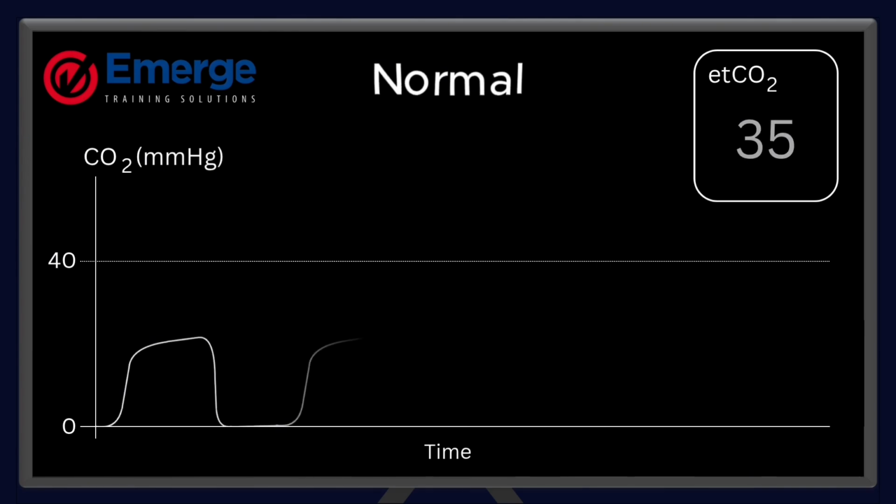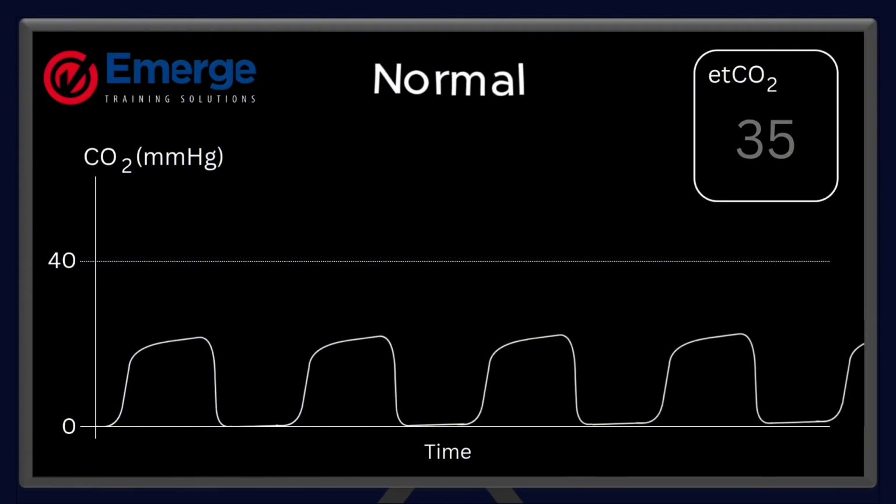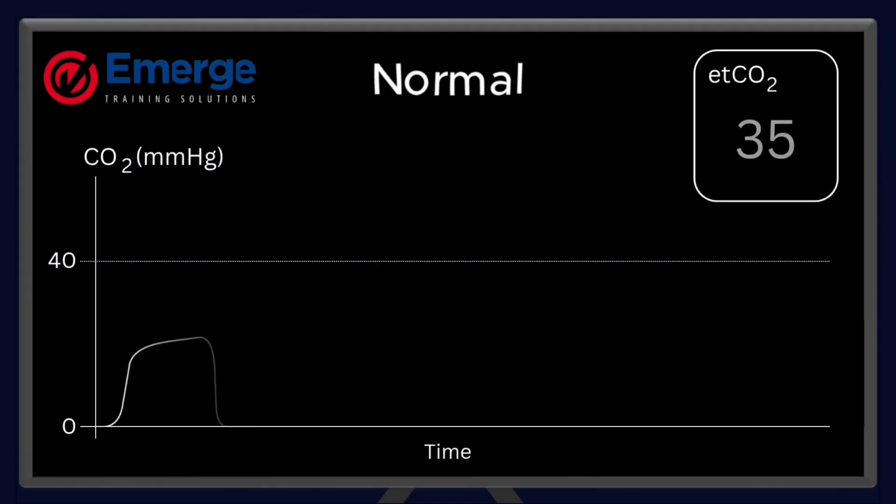You should always anchor your interpretation to this shape. Any change in slope, height, or contour reflects a physiologic change, and in the next slides, you'll start to recognize exactly why.